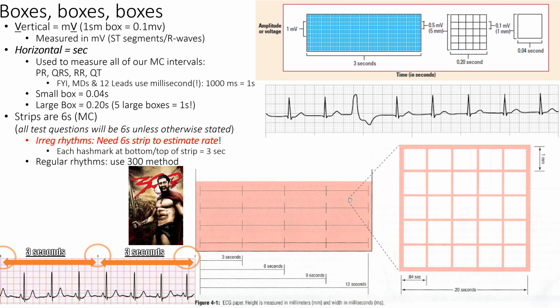That's how you calculate your heart rate. R to R is from R wave to R wave. Well, that's not isoelectric, so you could do here to here if you wanted to. All you're doing is looking at the distance between the different QRS complexes. The R to R is easier to spot, though. So you look from one peak to the next peak. What's the R to R interval? When you have the R to R interval, that's in seconds.